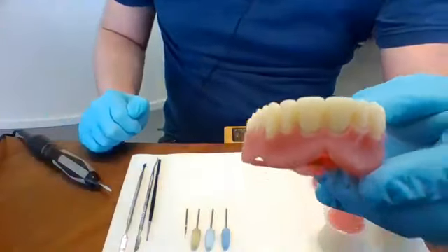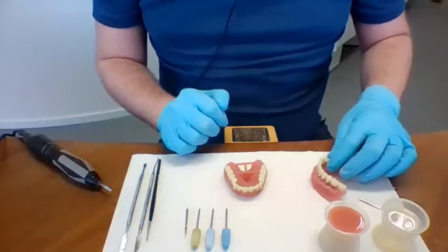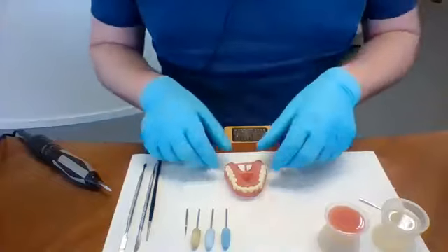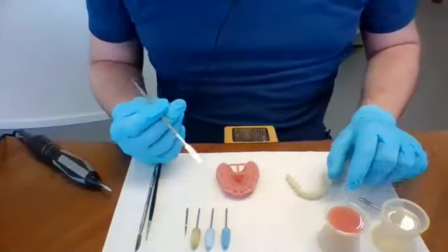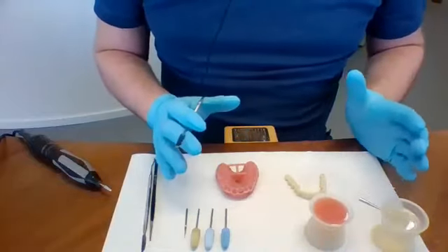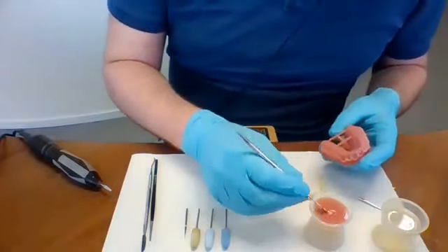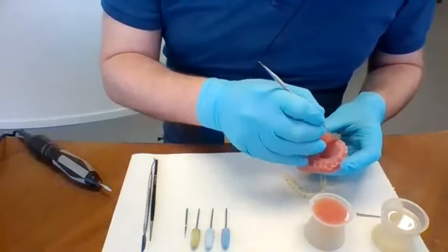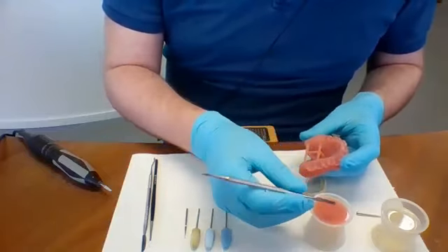The next step is to cement the tooth arches to the base. For that we actually use our Denture 3D Plus material itself. I put a little bit into a cup here. These parts are not post-cured yet. We are post-curing the parts after we have put the material in the tooth pockets and removed all the excess material from the outside of the denture base.